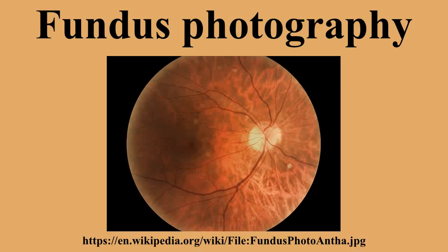The interpretation of fundus photographs, for glaucoma, must contain a description of the vertical and horizontal cup-to-disc ratio, vessel pattern, diffuse or focal pallor, asymmetry and development of the above factors. The retinal nerve fiber layer should also be studied and commented on. It is also a useful tool in objectively measuring torsion as well as in documenting and recording progression of diseases over time. Fundus photography does not replace binocular indirect ophthalmoscopy. It is a tool to supplement and complement existing findings and to maintain a record of disease progression.